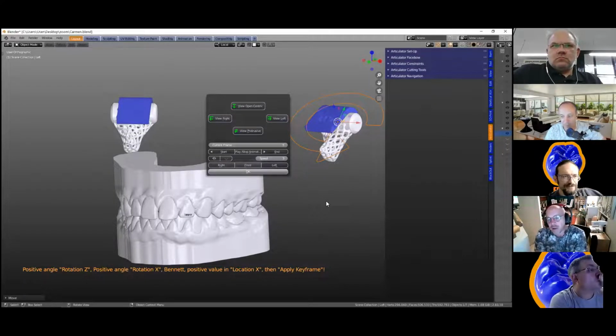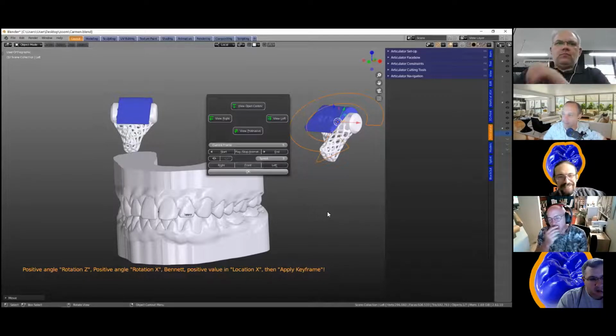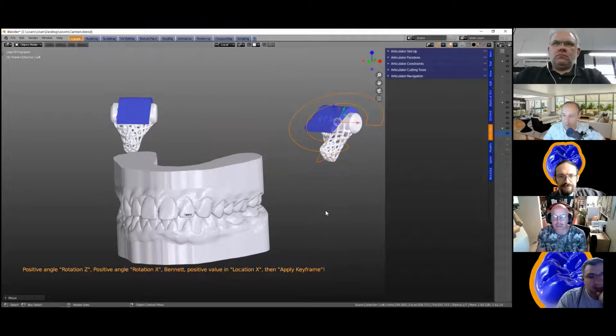Yeah, we need to look into this, and I've asked Alexander if we can look into that as well, because it would be helpful if it just stays put, with a little cross that you can click to close it. Yes, that's right. Unless we use an easier shortcut, maybe. I'm not sure, we'd have to think about shortcuts in Blender. I'll think about that, because these are pop-up menus that disappear whenever you click on the workspace, which is a bit annoying.